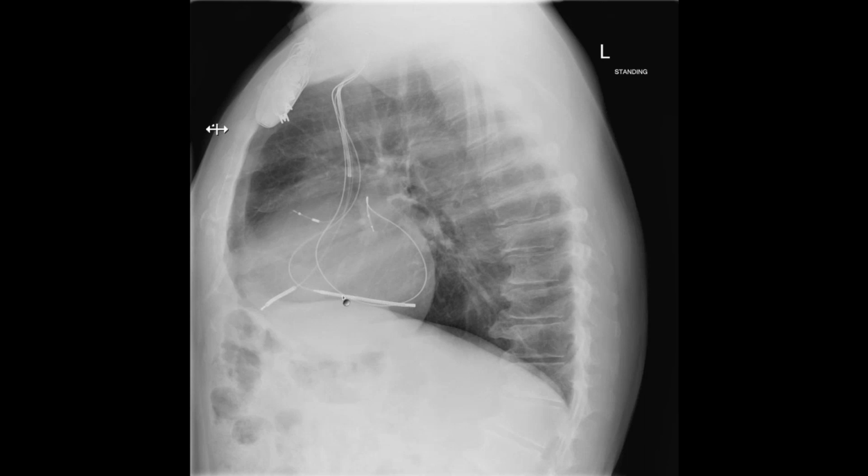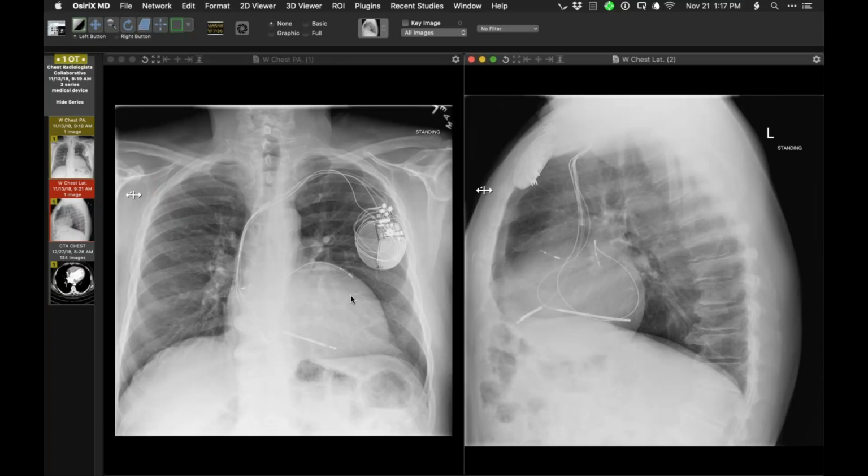But here we do have a coronary sinus extra defibrillation lead put in order to achieve a defibrillation threshold. So sometimes they need to do that in order to successfully defibrillate. There's a period of testing, and sometimes it's deemed necessary to have an additional lead in. And I think it's the shocking with a couple of vectors, both from here and there, that enables one to reach a defibrillation threshold and successfully have a defibrillation setup.